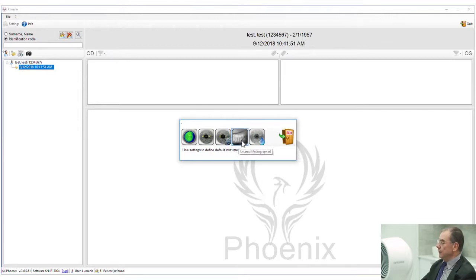This icon over here is the meibographer. We're able to use the program because of the infrared camera and light that we use within the system. We're able to actually image the meibomian glands themselves, and this allows us to grade the meibomian glands. And this is a great help, especially when we're going to be dealing with people that have a problem with dry eye.